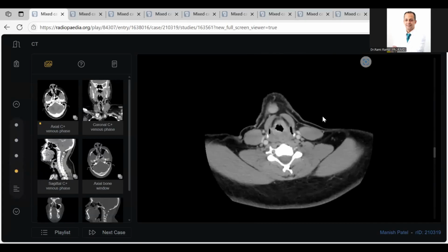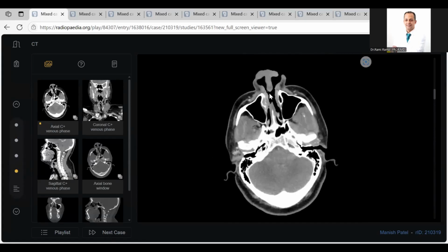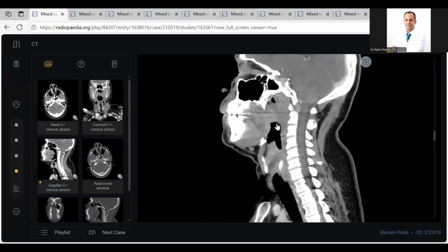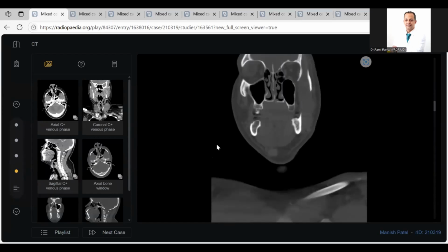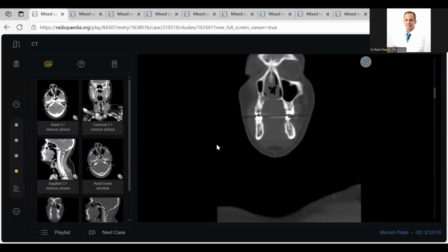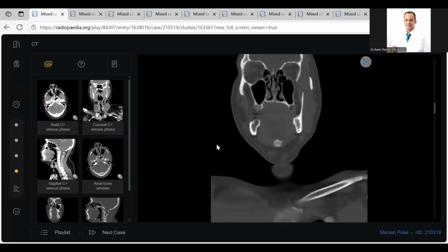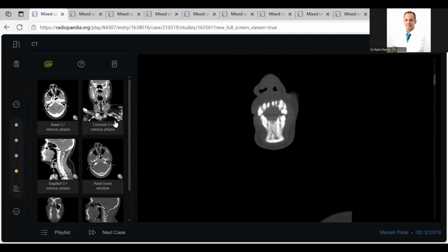A granulomatous disease causing multisystemic affection in the form of nasal septum perforation. And see here, the nose proper itself is thickened. Besides that, there is epiglottic thickening. Also the cribriform plate is eroded, but it is not obvious here because the images are so small. No problem. It is a multisystemic sarcoidosis, one of the case scenarios that may face us in the exam.